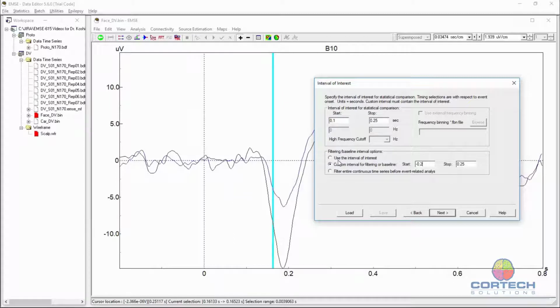We don't need to pad it because it's already padded for our interval of interest, although, take that back, we want to do baseline correction out there. So let's pad it another 100 milliseconds like we did when we made these averages. And then at the end, let's pad it out to 400 milliseconds. Okay, so the padding, as you recall, is so that we will allow our filter to warm up. Okay, let's go next.